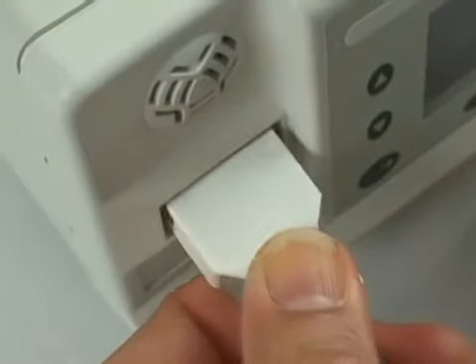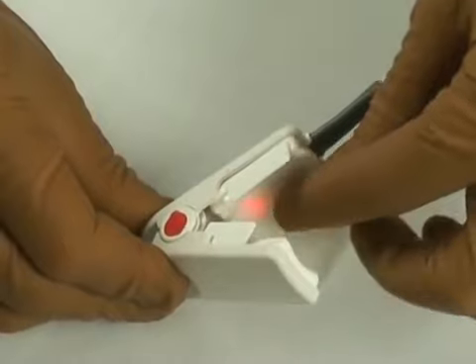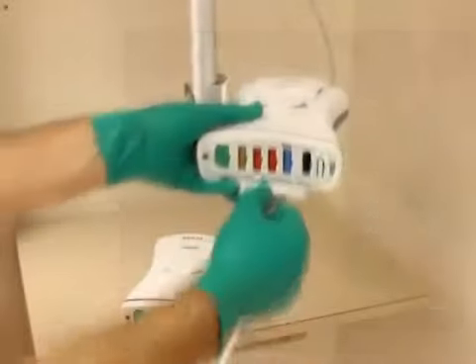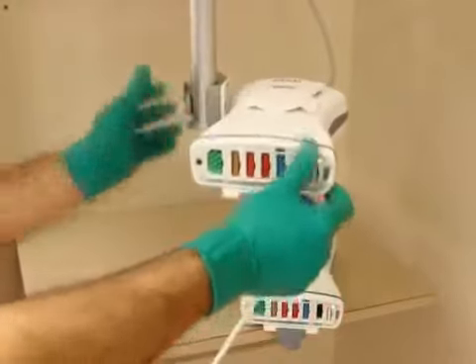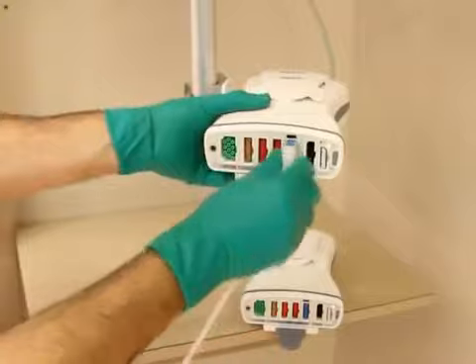If you can see the red light and have made sure the cable connecting the probe to the microprocessor is intact, clean the probe and place it on your finger to see whether the issue is specific to the patient. If this is not the case, it is possible that either the probe or the microprocessor is not working properly. Replace the probe, the microprocessor, or both as necessary.